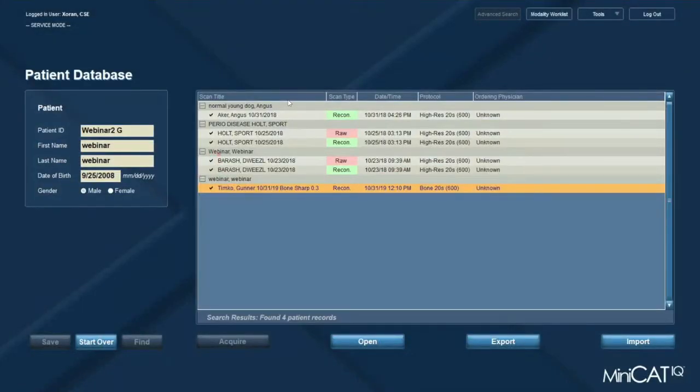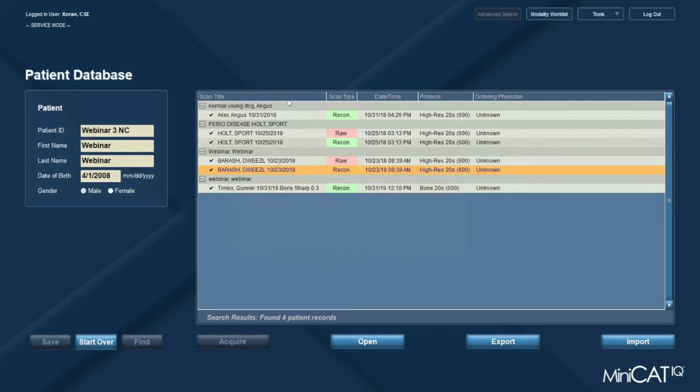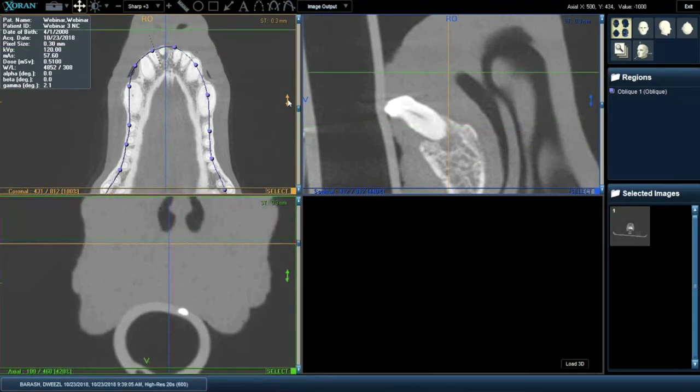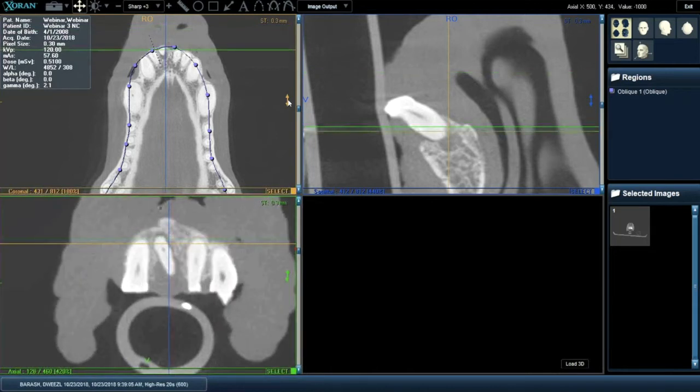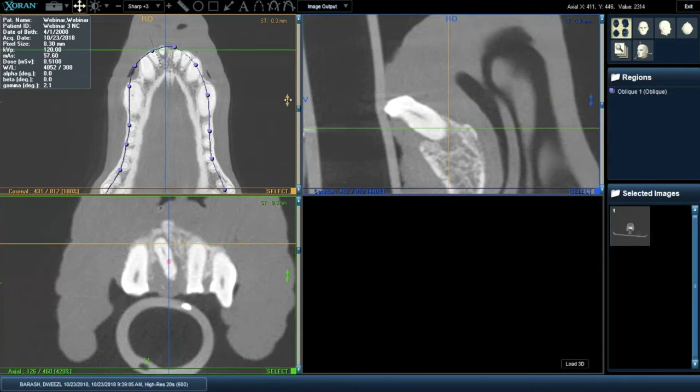And we'll move on and take a look at, this time, a situation that presents with bone loss. And I want to show you here, as this is coming up, that we have very localized bone loss. How do we see this? Again, we start by positioning the patient, scrolling through from the anterior portion to the caudal portion. And as soon as we do this, we start noticing bone loss on this anterior portion of the tooth, just this one area here. And let's take a closer look at this.